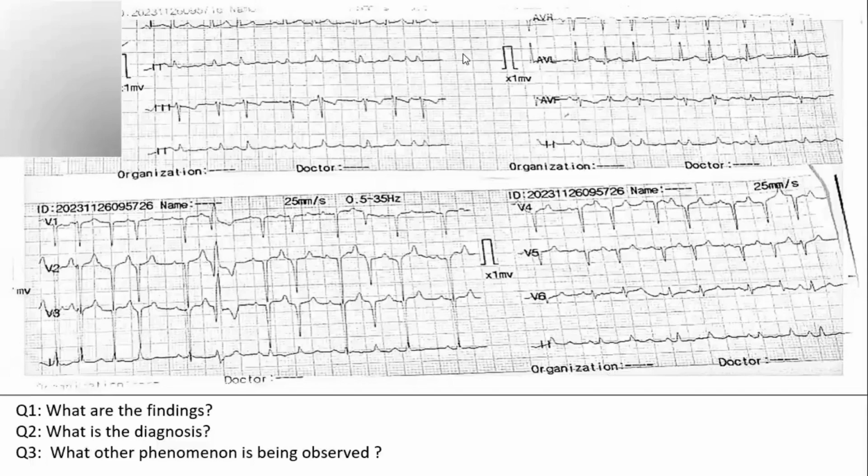So these are the questions. I think they will not ask you more than 3 questions, probably even 2, as there's no time. You have to write that in just a few minutes, so you have to be quick in making the diagnosis. Just train your mind, because sometimes the questions might help, and sometimes you just have to see the right lead for that. So what do you think?